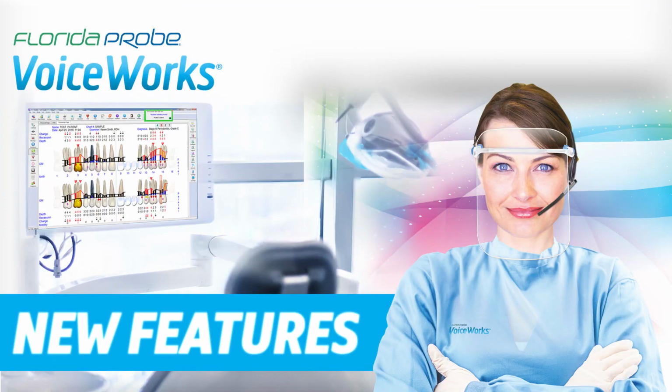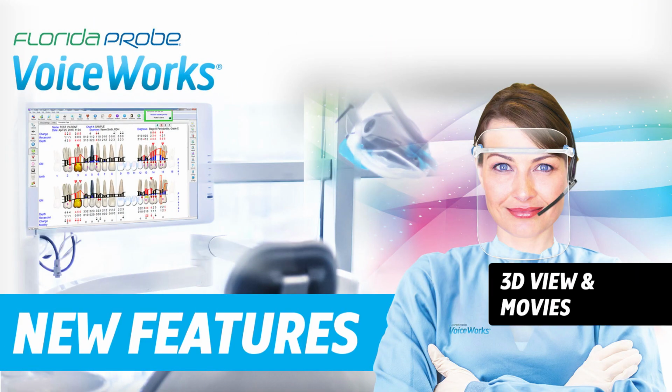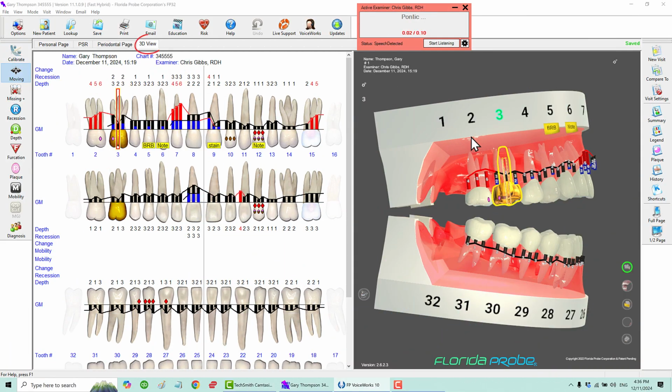I want to give you a quick tour of the new 3D view that Florida Probe VoiceWorks software offers on version 11 and higher. It's an exciting opportunity to take a flat 2D chart and put it into the 3D world. What's cool about this is the speed and the efficiency that you get in the 2D world now translates instantly to the 3D world.